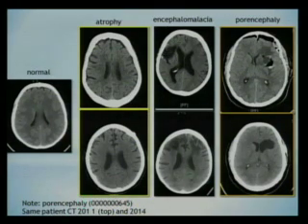Okay, and I couldn't be more precise than Peter Myers. So you get this here, encephalomalacia, and eventually it communicates with the ventricle, and then it's called porencephaly.